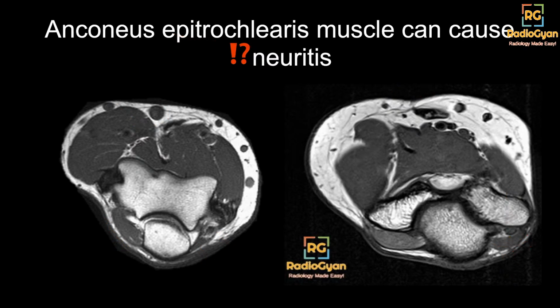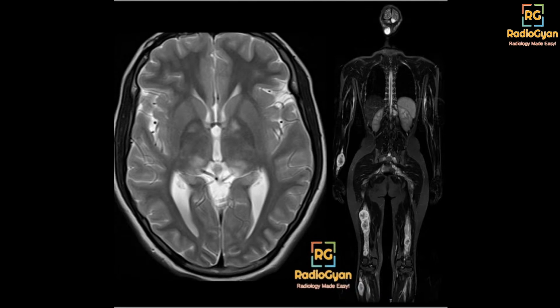Okay, so this is our next case. It's a fairly typical case. I've included it here because it comes in the spectrum of MSK neuro abnormalities, and just as a kind of icebreaker, breaking the MSK monotony.